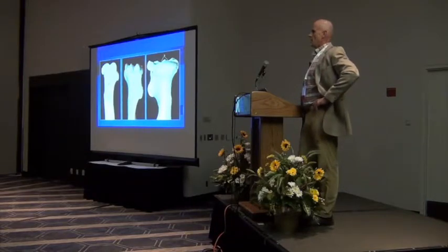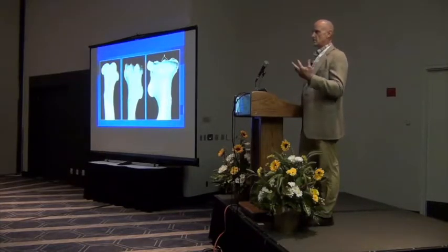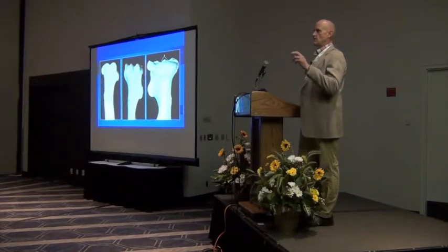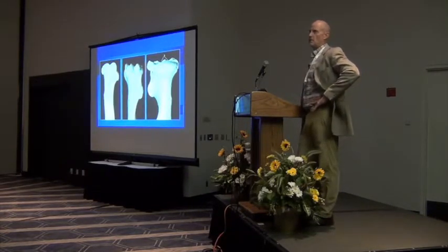So, that being said, let's get into some of the imaging, and I always start off with osteology, because when you look at these areas, joints in particular, you need to know the bone contours. And this is a very unique area. I would strongly suggest, if you haven't done it already, go back. One of the best references for what you see on a radiograph is Adams. Adams has got a nice line diagram, and it shows you all these different contours that could potentially be projected in your radiograph.